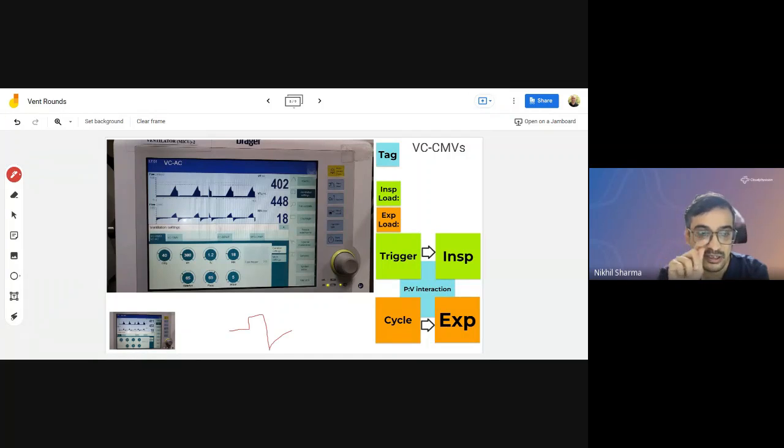In the pressure time scalar, the pressure waveform from the baseline, above the peak, has to take a curve upwards rather than a straight rise. The curve isn't there here. Exactly, that's what I'm drawing for you.